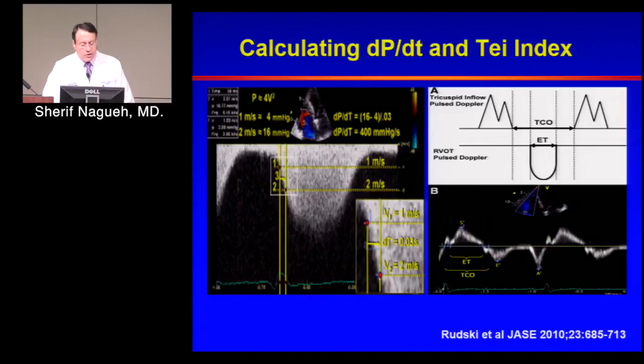Most of the errors are in time measurements. As you see, the scale here is that every 2 points is about 200 milliseconds. You can make it 100 with some ultrasound systems if you can get faster sweep speeds, but in general, we are looking at very small values. And this is where the problem happens. So 30 milliseconds, 40 milliseconds, and so on. So I wouldn't recommend we use that for quantitation.